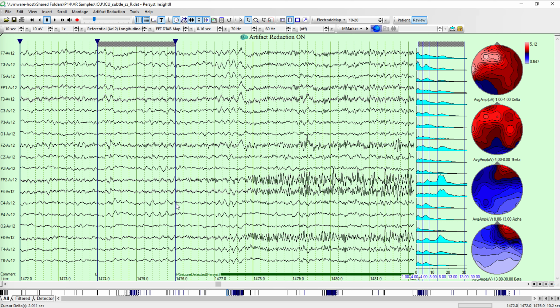And that's fine. You can pick something that's optimal for that. Or you can increase the sampling rate. That increases the points as well. But we'll set this to 2 seconds with the default at typical scalp sampling ranges. If you do start getting less than a couple of seconds or 1 second, that window will disappear. The reason is you don't have enough points to calculate the FFT. So just make it a little bit bigger and it'll work fine.